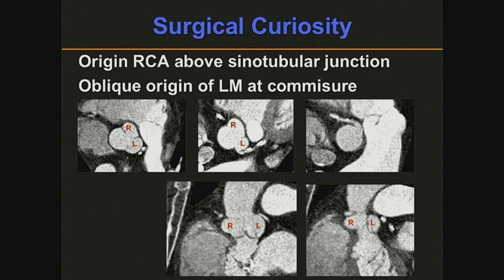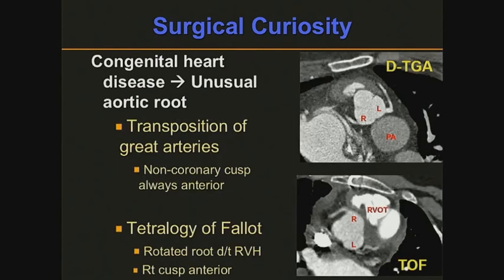And here you can see it again. Here's the right sinus, RCA coming up a little bit more anteriorly, but still above the sinus. You can't see your mouse unless you do it on that screen. Oh, I see. And then on the left side, you can see it's coming off center here. And with that type of thing, it's going off there.